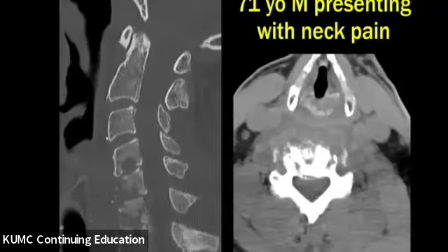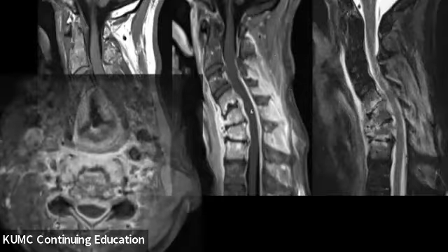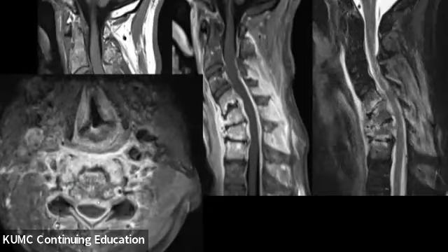A 71-year-old male presenting with neck pain. We have a sagittal CT through the C-spine with irregular erosive bony erosion of the lower vertebral bodies, and then ill-defined prevertebral edema and inflammation. On follow-up MRI, we have vertebral body collapse and kyphotic or gibbous deformity. We have confluent T1 hypointense enhancing marrow signal with subligamentous extension of the phlegmon and extension into the epidural space posteriorly as well. Axial images confirm those findings with all the inflammation in the perivertebral space.